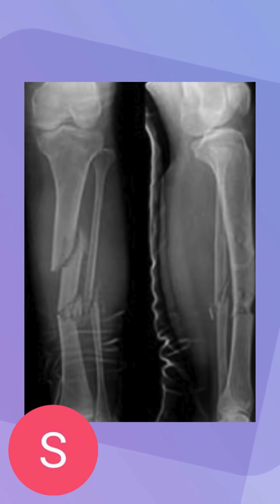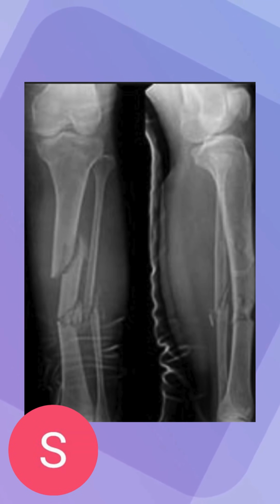This is another example over here of the tibia, the leg bone, sorry. This one I provided two different views. One of them is facing us and the other is at an angle from the side. I did this so we can take a look at the fracture. In the first one, we can see the segmental fracture type. We can see the two bones sticking outside, and we can see that middle piece being displaced. However, on the second, right half, we can see the same fracture, but it seems not as bad. It looks more like a small linear fracture or a transverse fracture, nothing too major.